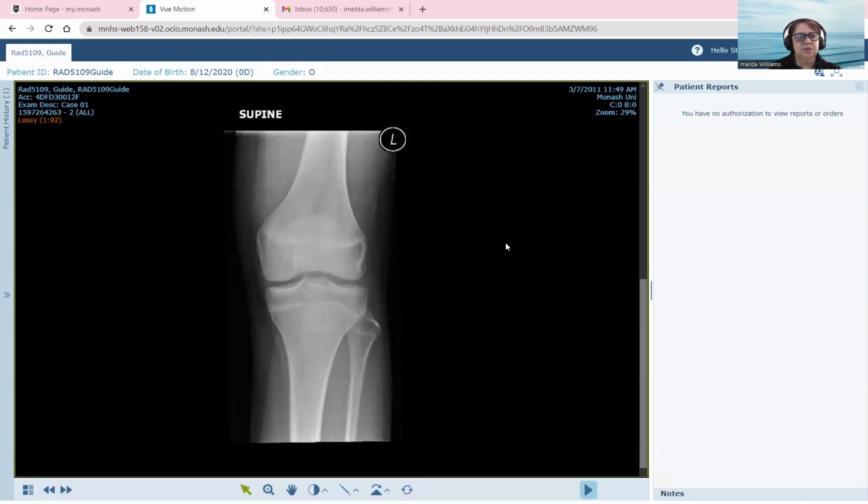Good day. This is just a short recording to demonstrate the image manipulation software. Some of you might be quite used to it because this might not be the first unit that you're doing for the grad cert.